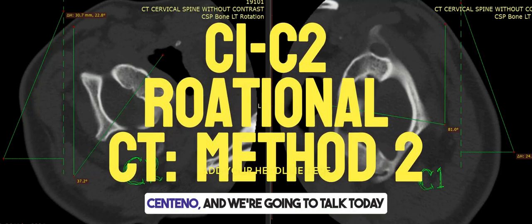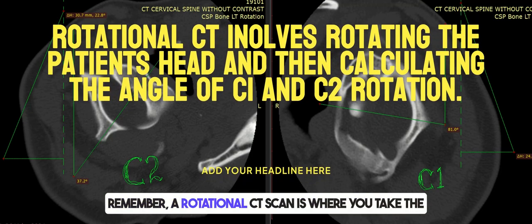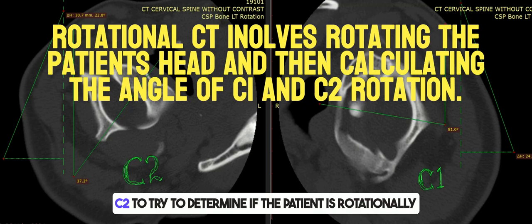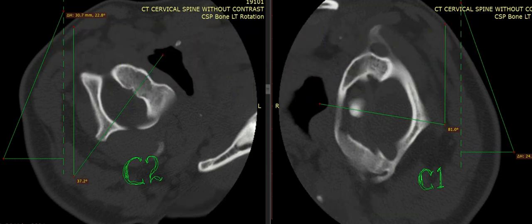Hey, it's Dr. Centeno, and we're going to talk today about an alternate way to measure C1, C2 rotation on a rotational CT scan. Remember, a rotational CT scan is where you take the patient's head, you're supposed to turn it 90 degrees to the right, 90 degrees to the left, and then take a CT scan looking at the rotation of C1 on C2 to try to determine if the patient is rotationally unstable at the atlantoaxial joint.